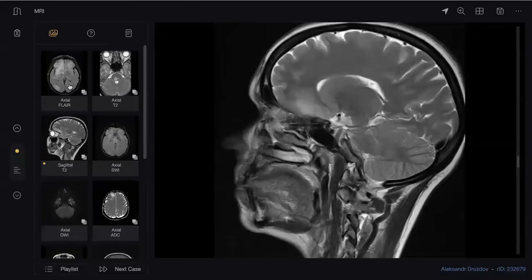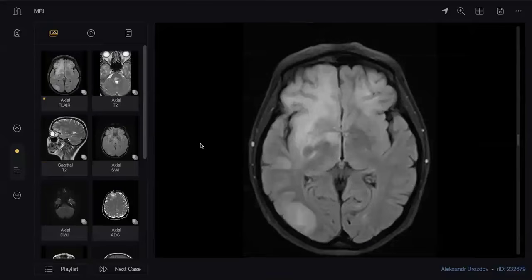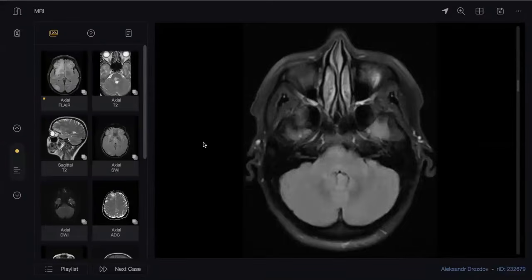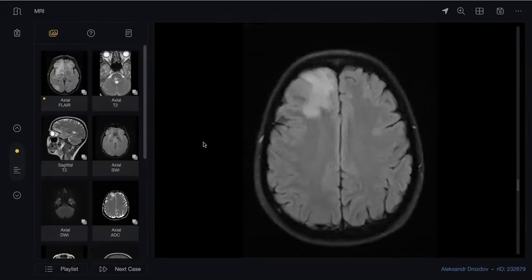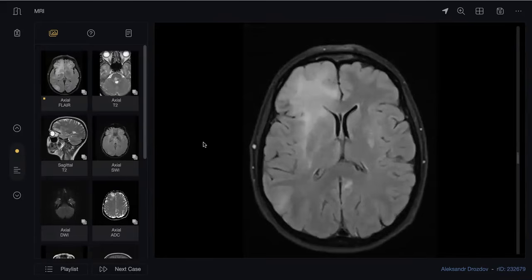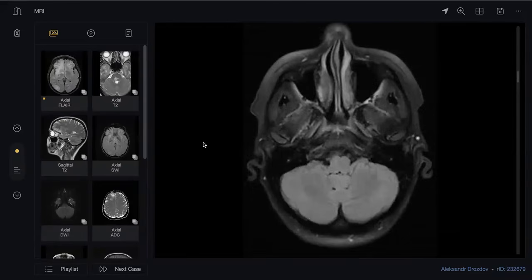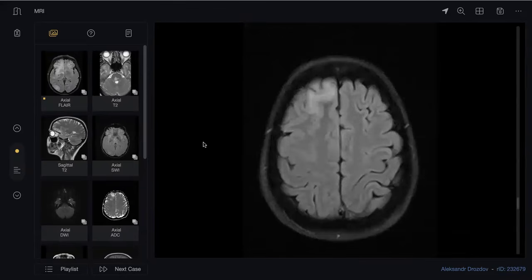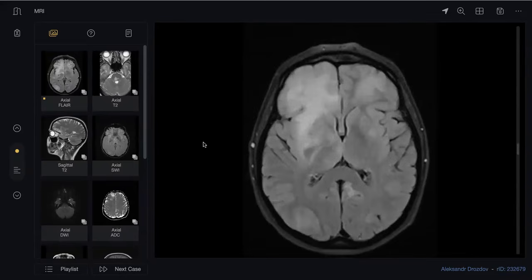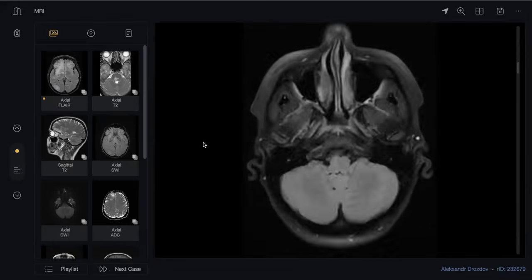But I have a few questions for you. So this patient has a PML infection. What is the infecting organism here? I think it's called JC virus. So the patient has JC virus infection and the patient is having AIDS. So they start antiretroviral therapy for this patient, and suddenly these lesions start increasing in size.